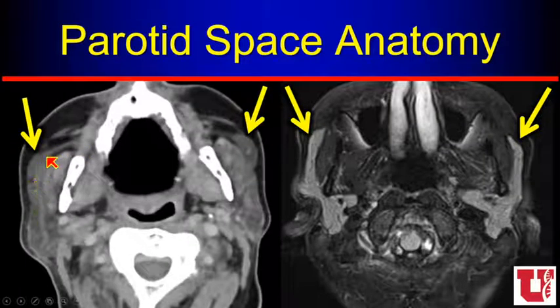So we remember that the parotid may have accessory parotid tissue superficial to the masseter muscle, and this might be all of the parotid tissue. We might not see any in the parotid bed itself. We might only see parotid tissue here.